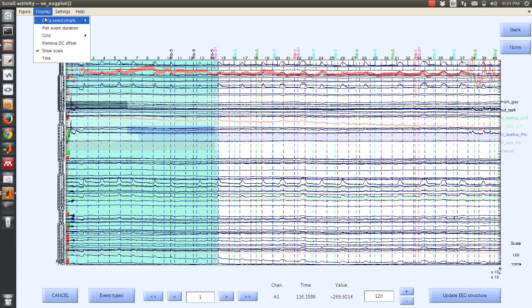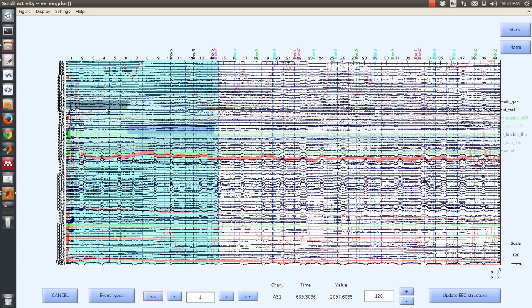So now what we have here is the marks that are dimmed out in the background, but we've marked, based on the correlation coefficients across channels, channels that had unusually low correlation coefficients to their neighbors, and these are now grayed out in red, and we can see some bad channels grayed out in red.